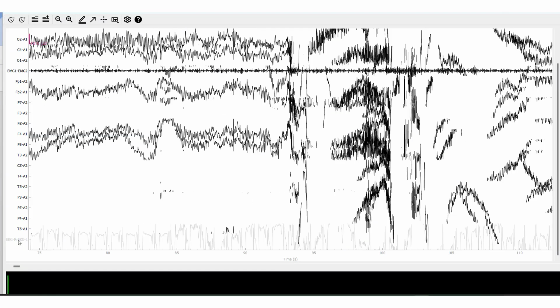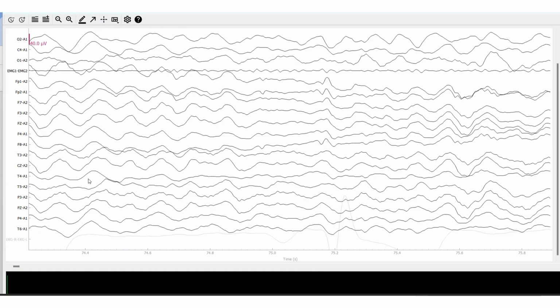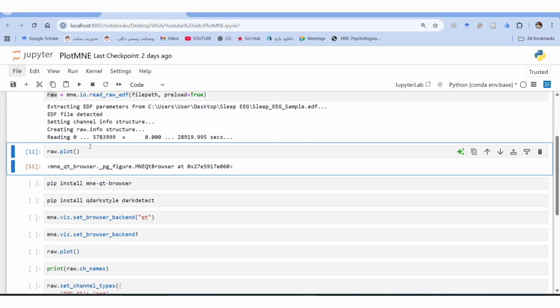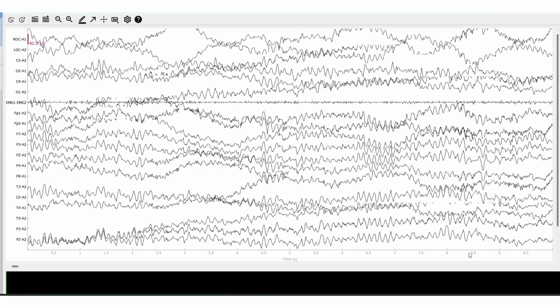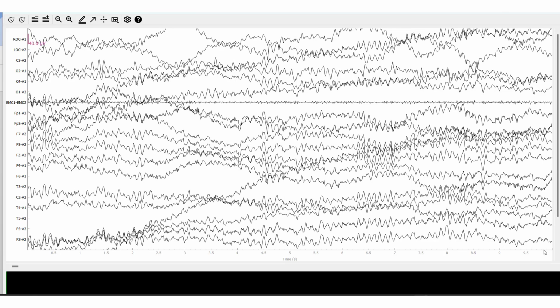By default, this visible window is 10 seconds. As you can see, when I open the signal again, the duration is 10 seconds, from 0 to 10. When I press the End key, it increases the window by about 2.5 seconds, and when I press Home, the same amount is reduced.